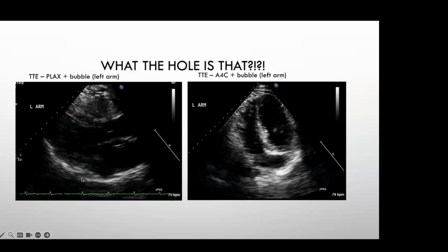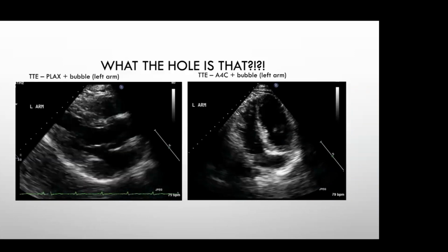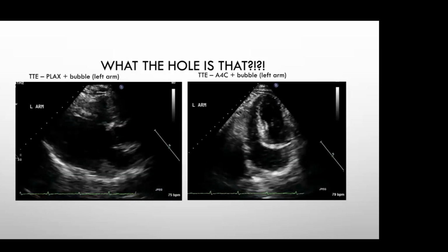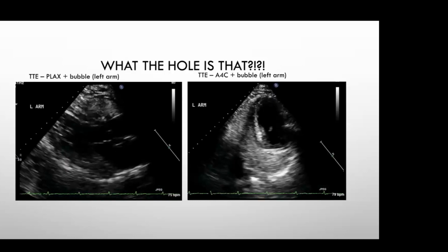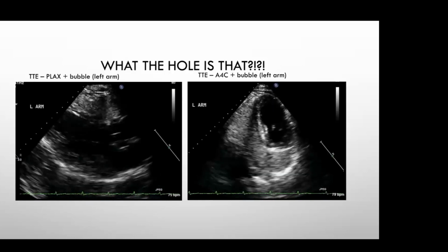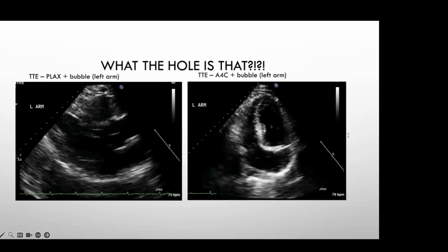And anybody want to say what the finding is here, what that diagnosis is? If no takers, I will explain it.